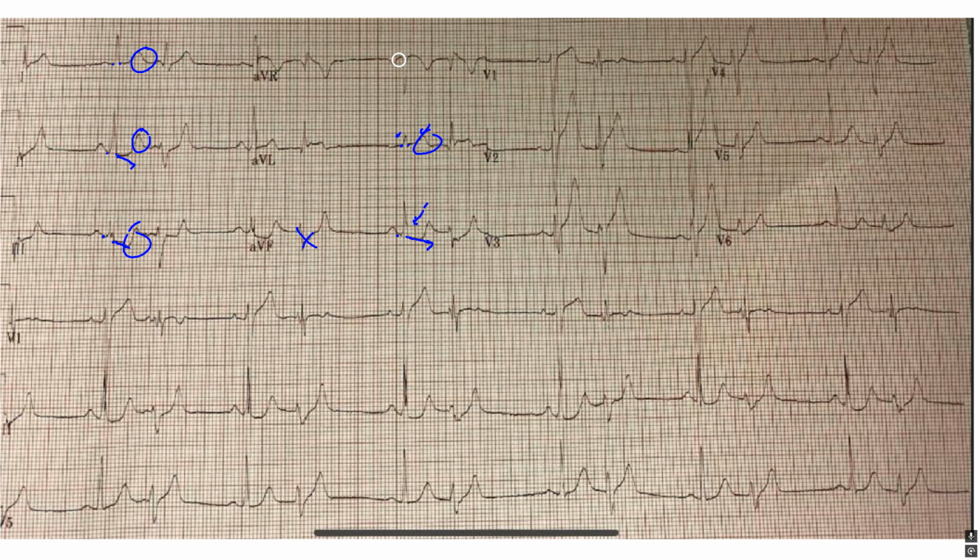Up here in aVR, I'm not seeing much J point deviation, inverted T wave, which is normal. Over here in V1, V2, let's distinguish our native beats from our PVCs. Here's my native beat. Up here, I am seeing J point elevation in V1 with an upright T wave, which is abnormal. Anytime I see an upright T wave, I go down to V6 and ask, what does it look like in V6? Ooh, this one's tall. This one's not taller, but that's still concerning.